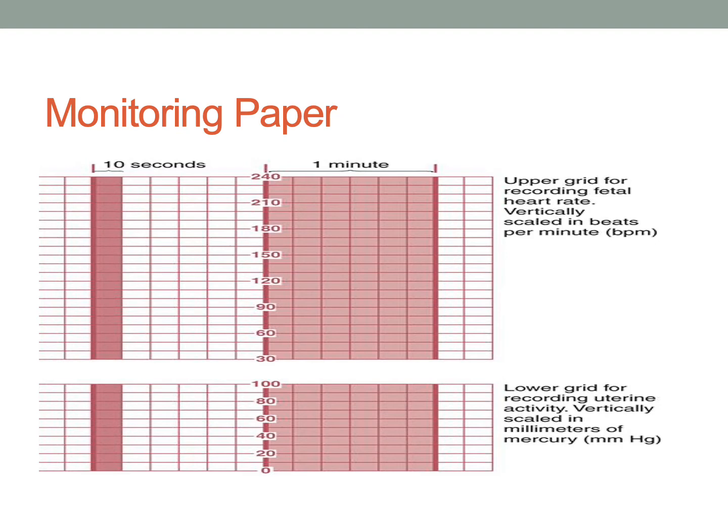In terms of the heartbeat, we talk about the beats per minute. The paper shows from 30 all the way to 240. I hope you never have to see a heartbeat of 30 or 240. The parameters that we look at and what we expect range from 110 to 160. So it's very narrow from here to here. It's important that you know that.